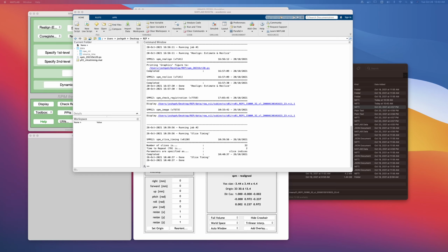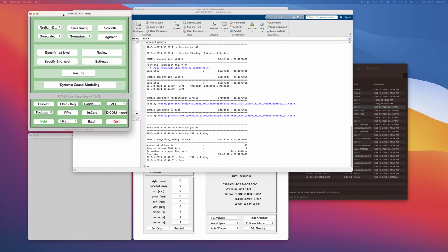And because the contrasts are different, you can't really use the same motion correction kinds of algorithms. You're going to have to use something more generalized. And that's what co-registration does. Okay. And to do that, it's pretty easy. And we will talk about it in class, about the principles of why we do co-registration, how we do it, in what order, and all that.